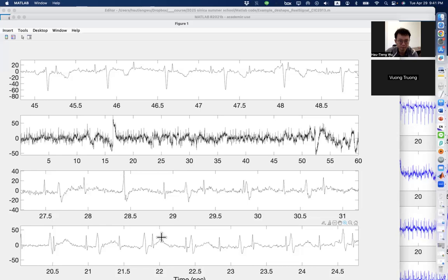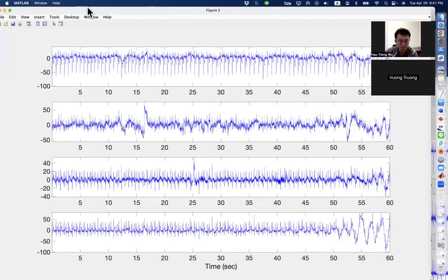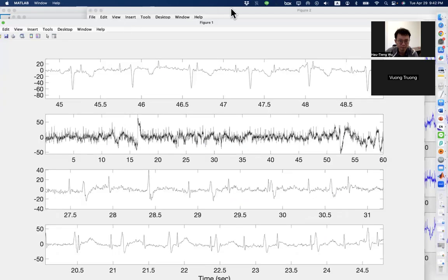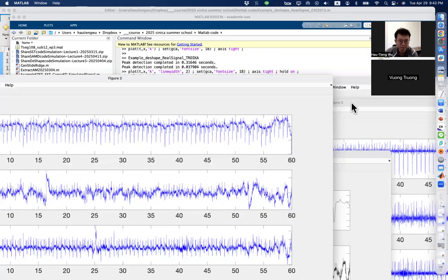dipole current modeling your electrophysiological dynamics, sometimes you may see that the fetal ECG might have similar strength to the maternal ECG, like the heights are the same. Okay, then what we do is this second figure, right? And this second figure is, in this case, the same as the first one because there are no artifacts. Okay, very good. So we don't see anything fishy here.